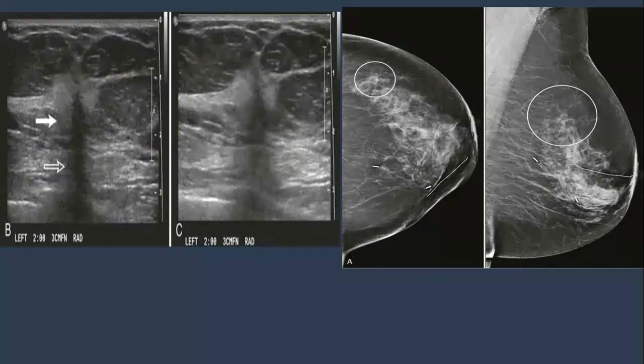It demonstrates shadowing lesions. Yes. What is the difference between the two ultrasounds, between this and this? Here on the left side, the acoustic shadowing is more. Maybe harmonics were added to the right one.